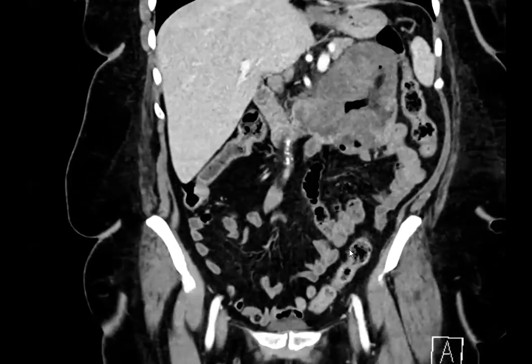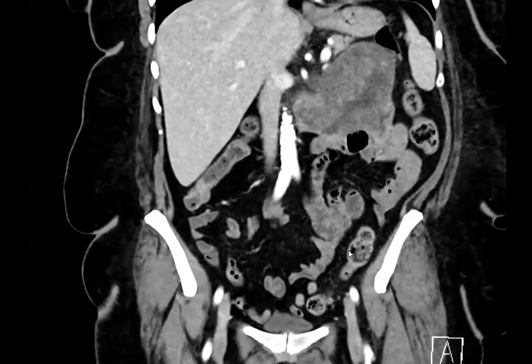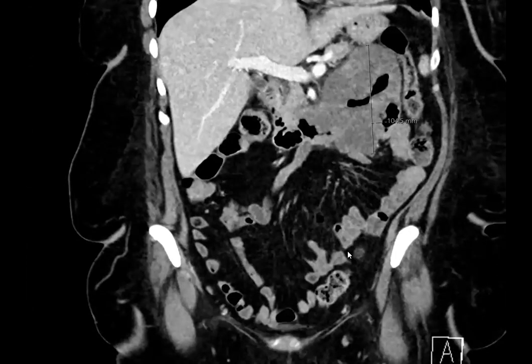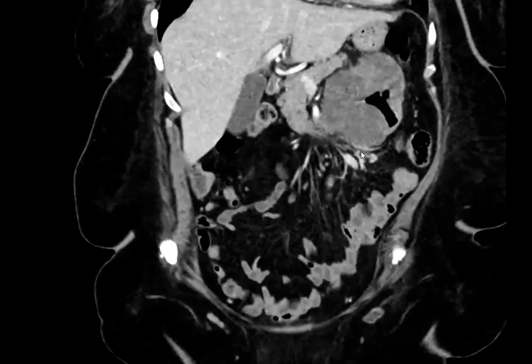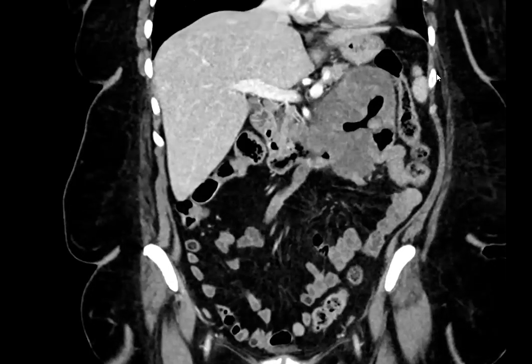There's one more thing you did not mention. So just an adenocarcinoma. And actually that's what this turned out to be. That is true. So this is just a small bowel adenocarcinoma. It is a little atypical. Usually they are apple core lesions that cause upstream obstruction. They are overall rare, much rarer than colon cancer, but they can be very aggressive. This was a moderately differentiated adenocarcinoma.